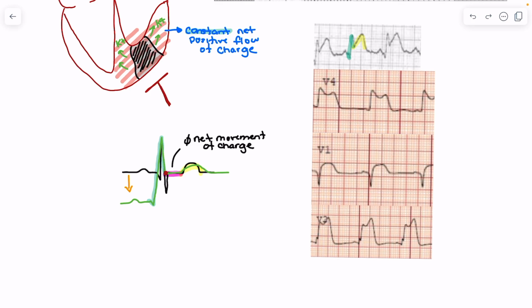So if we go back and ask, well, where is the J point then? We know the J point occurs after our QRS complex, where it is negatively or positively deflecting from baseline, at the onset of a rest period followed by the T wave. If we don't have the rest period, then we're simply looking at the junction between the end of the S wave and the start of the T wave, which is dotted in red here. So the ST segment lives where that J point lives, and that's what we'll be using in order to determine ST elevation from baseline.